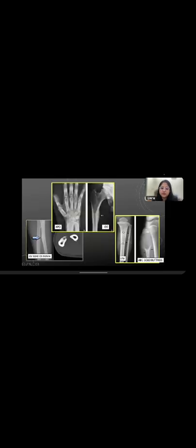Solid periosteal reaction, if it is a single lamella, is very indicative of stress fracture or LCH. Undulating solid periosteal reaction can be seen in varicosities or chronic lymphedema. Solid type reactions are also seen in ABC and osteoid osteoma. But if there is interrupted periosteal reaction in benign conditions, then you have to think of osteomyelitis, LCH, and subperiosteal hemorrhage.